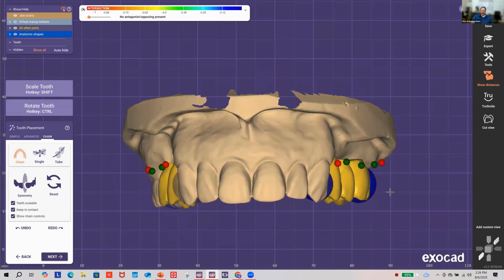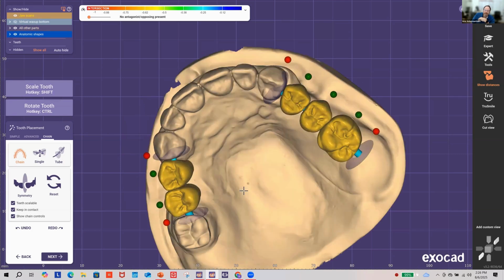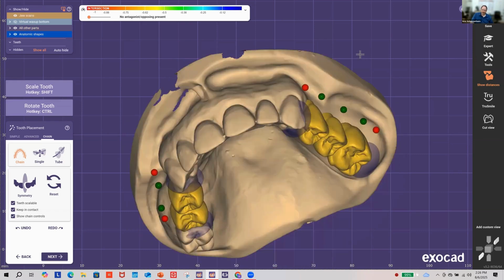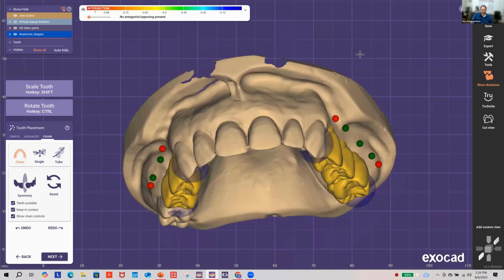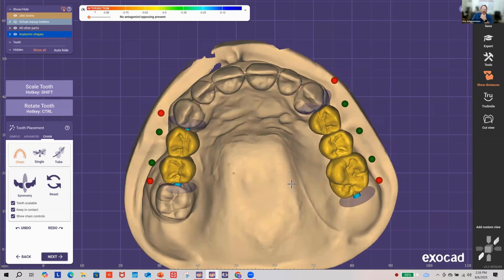We can kind of see that discs are nice because they hang out, so I can kind of pull it down. Now, I don't have opposing in here just because this is just for example. But of course, if you had the opposing, you'd position them so that aesthetically, or anatomically, they're meshing in with the opposing. But that kind of looks good. I'm over top of the ridge.